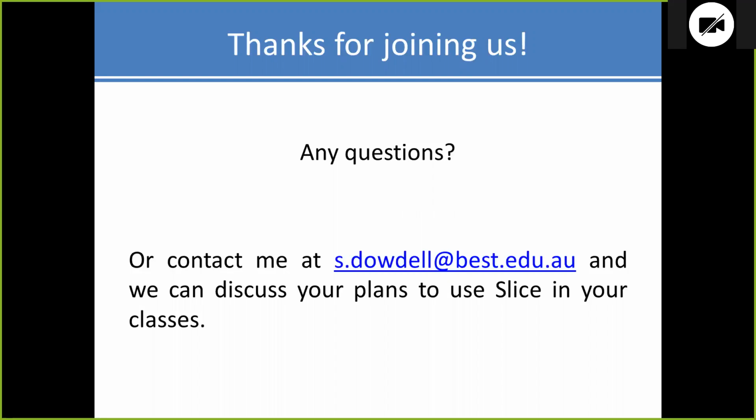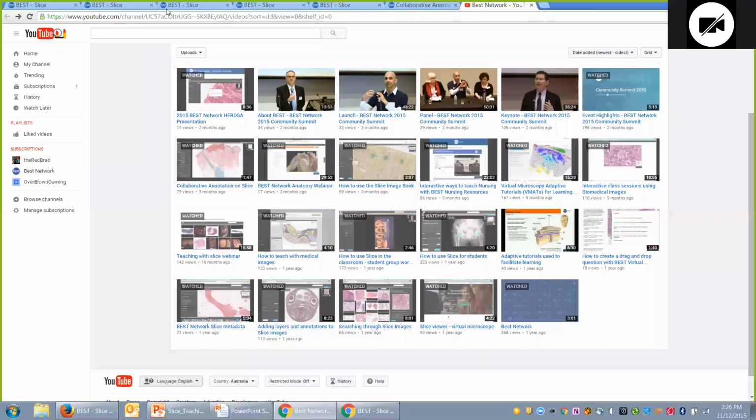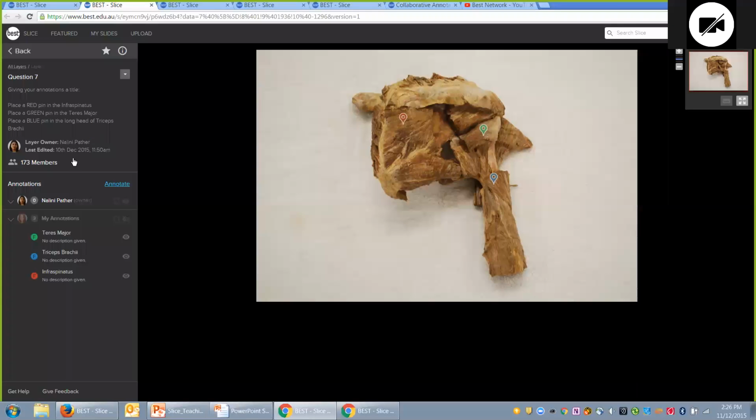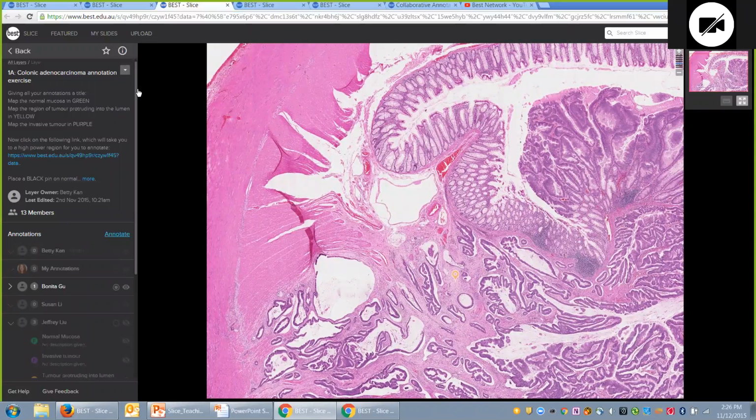So can I embed a link in an annotation layer? Absolutely. This is something that we've deployed in a couple of class activities. You can either use the full annotation layer that has a lot of information and copy that entire URL into the description box. So let's just grab one that I can edit.